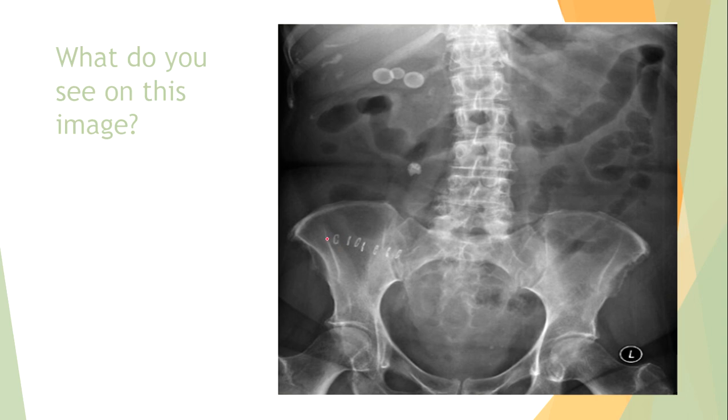So here we see clamps after surgery, gallstones, and some artifact here.